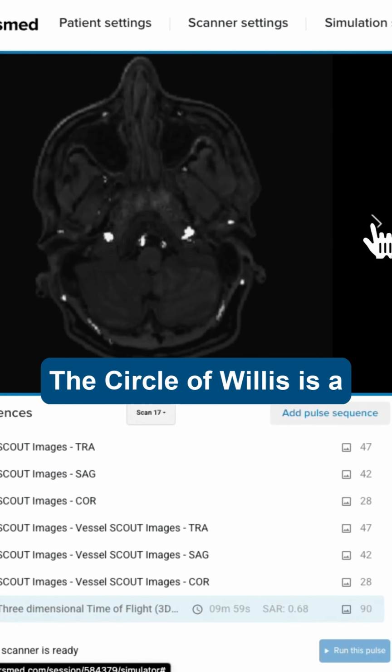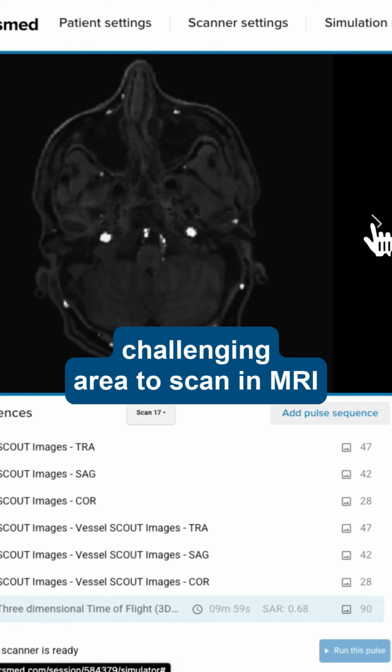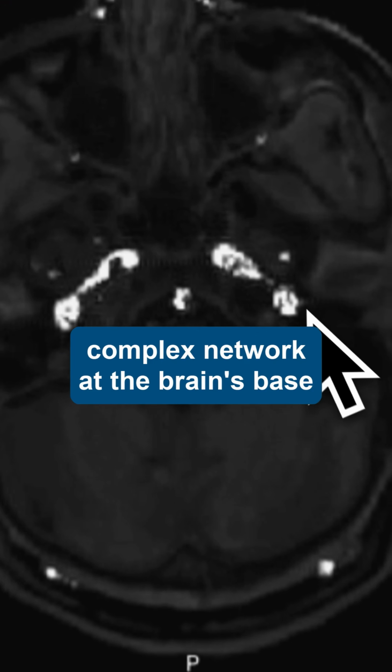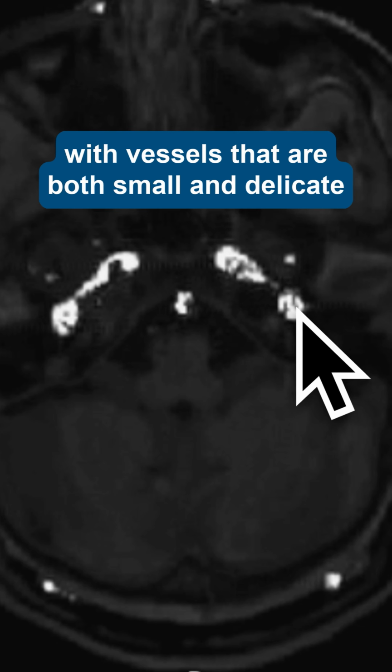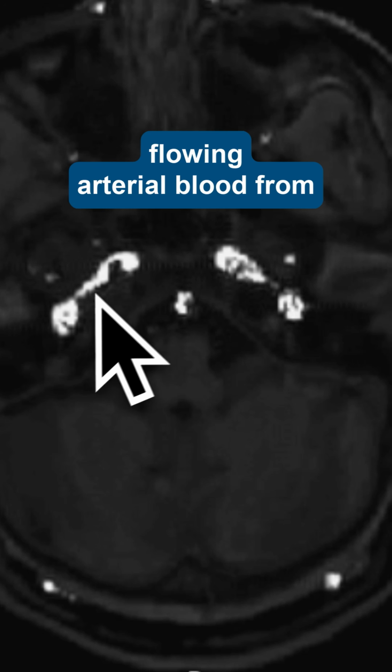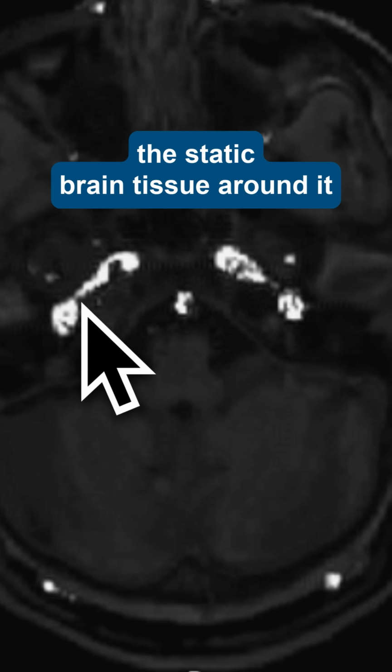The Circle of Willis is a challenging area to scan in MRI. The arteries form a complex network at the brain's base, with vessels that are both small and delicate. To get clear images, we must separate flowing arterial blood from the static brain tissue around it.